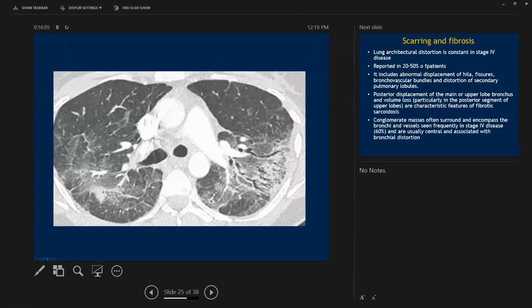So in this case, you can see the upper lung predominant ground glass. It's peribronchovascular. And here you can see fibrotic changes because there's also established traction bronchiectasis. In addition to that, I'm also seeing some tiny micronodules. So this was actually pulmonary sarcoidosis.